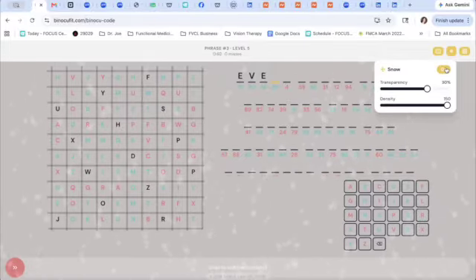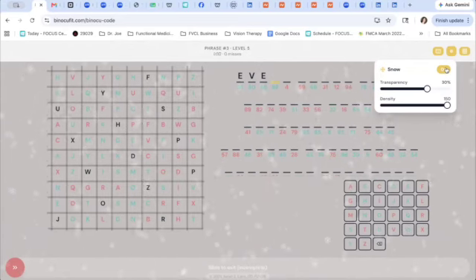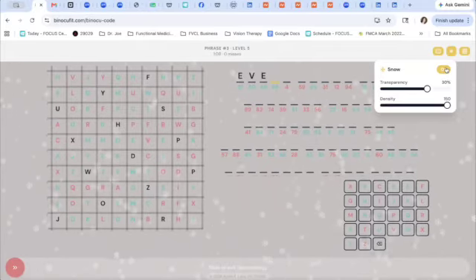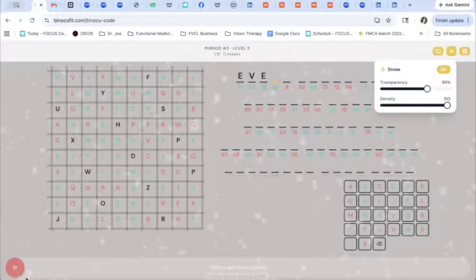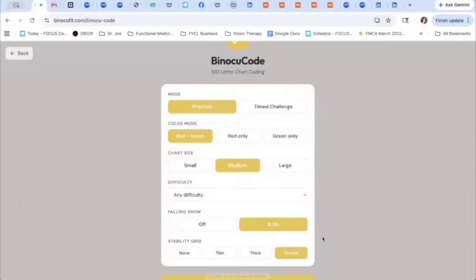I've used this exercise just like a heart chart, not necessarily going with the code the full way. But it's been very helpful because it completely randomizes it every time it comes up. All the codes that I have in there to solve are programmed to not use the same number or the same position more than once unless it's already been used every time that it shows up in the chart. And I have different levels. If you complete this whole task, it's going to tell you the time that the patient took to do it and also how many misses they made. So you'll see if they just randomly were clicking or making the wrong decision about it.